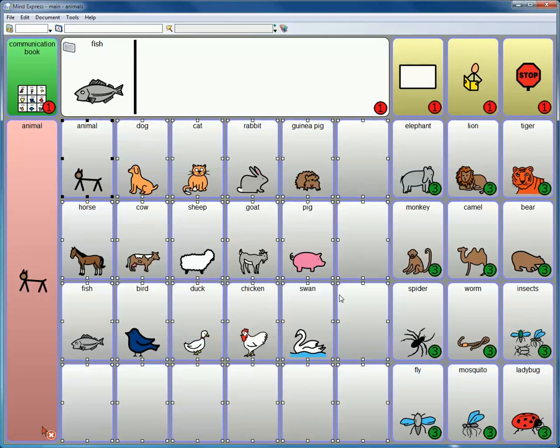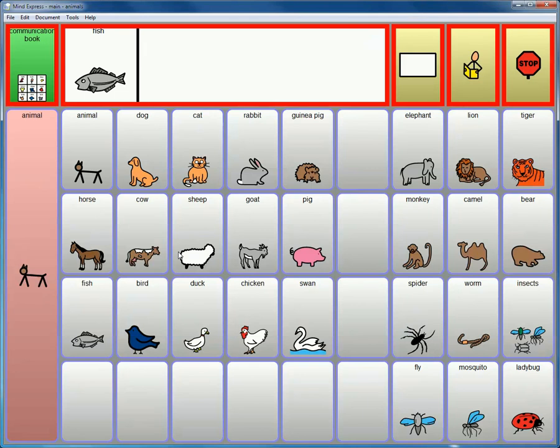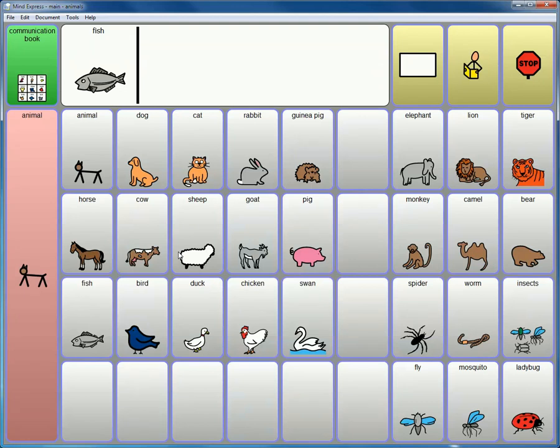So as soon as you have one cell that has a scan group, the system will use the scan groups and it will not include any cells that are not assigned to a scan group. So in this case, it will keep these cells from being scanned. So if I go back to scanning, it's important that you know that they need to be in a scan group to be scanned.